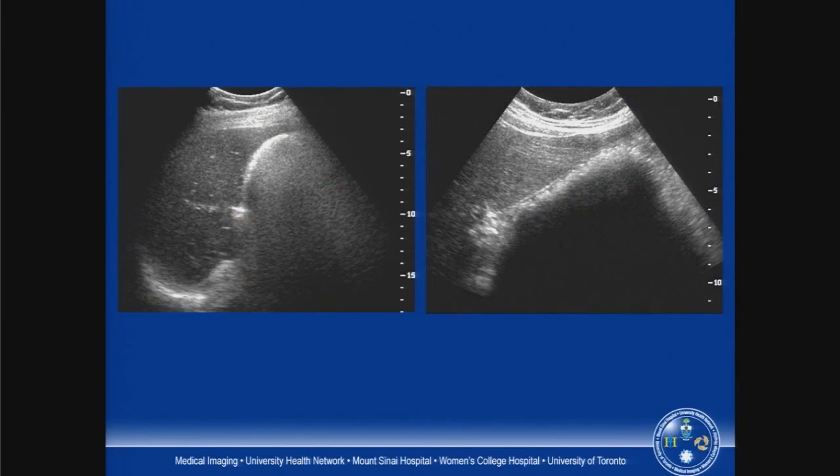Now, how does emphysematous cholecystitis differ simply from a gallbladder that's packed full of stones? Well, often the latter patient won't be acutely unwell, so that might be the first clue. But from an imaging perspective, we can actually see the gallbladder wall in this case as a very thin, smooth, echogenic line. And then there's a second acoustic interface, which is more irregular, which is the front edge of the stones filling the gallbladder lumen. And then look at the contrasting shadow from these calcified stones, a very clean, dark shadow. And this is the so-called wall echo shadow sign, or the WES sign.